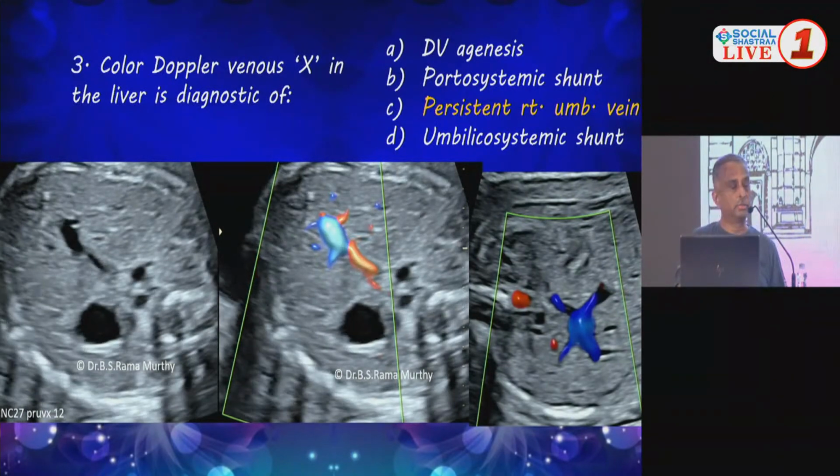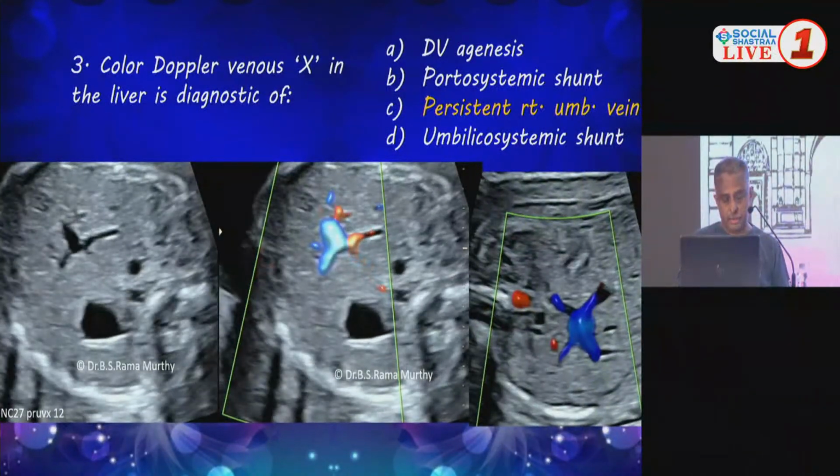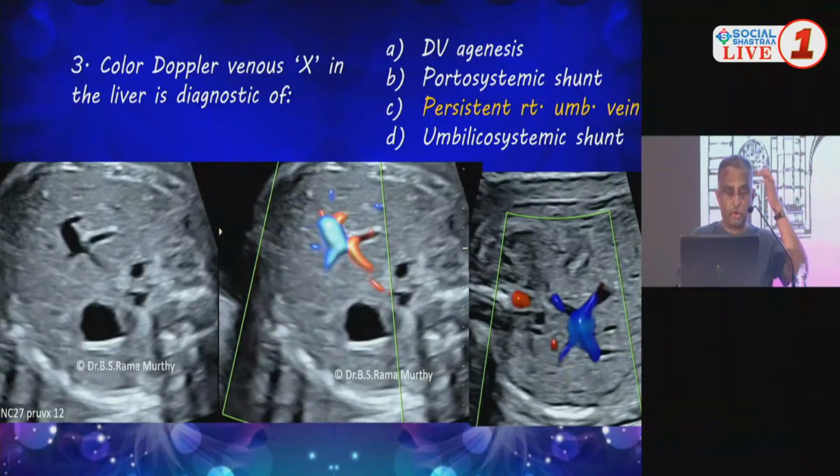Okay, we'll move on to the next one. That's a good green peak that we see there. We will go to question number 4.